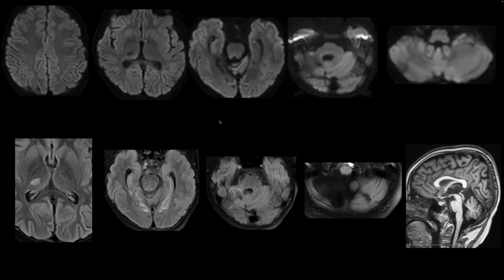So as you said, maybe the blood-brain barrier is not yet repaired, but then it should not happen at different sites every time and show different vessel involvement at different times. Where would the blood-brain barrier come in for the vessel wall? I'm not sure I understand that. For example, extracranial arteries also sometimes show vessel wall enhancement. That's what I mean. So I don't know exactly. Here it will probably be endothelial damage, what we see in post-COVID. Yeah, I think it's some sort of damage which just keeps enhancing for some time.